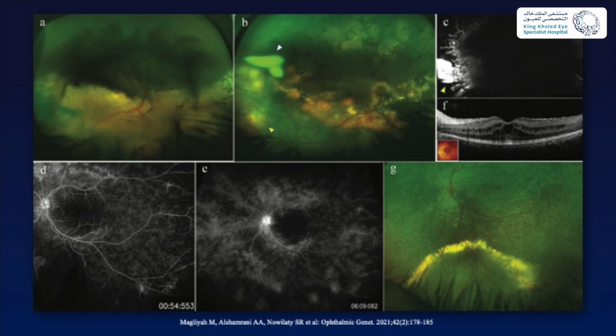After that, he received the triamcinolone acetonide injection, as you can see here in the fundus photo, but the triamcinolone acetonide did not lead to regression of the subretinal fluid. The photos at the bottom are for another patient with inferior lipid exudation and exudative retinal detachment, as well as telangiectasias, as you can see in the fluorescein angiogram.